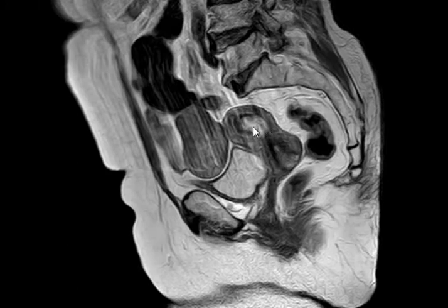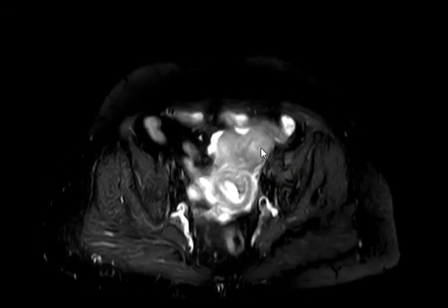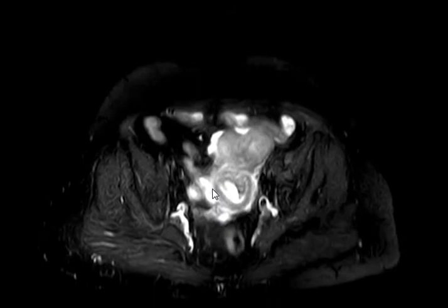The important thing, of course, this is just a subserosal fibroid, don't worry about it. It's expected at this age. There is invasion of the junctional zone. Now, go to the T2 fat suppressed, see the surrounding tissues. Are they invaded? There is small amount of free fluid here and there in the pelvis. However, the surrounding fat looks good. It's not stranded. No signs of edema. So probably it is within the uterus.